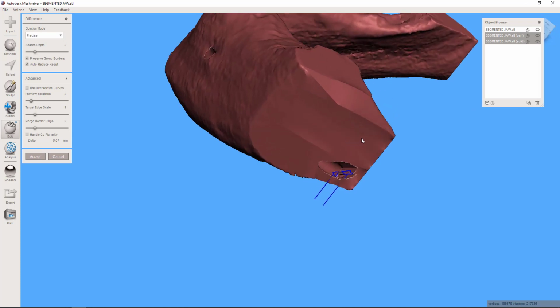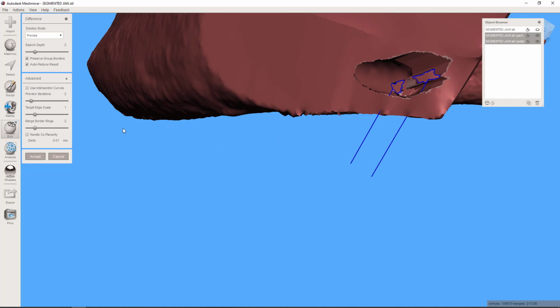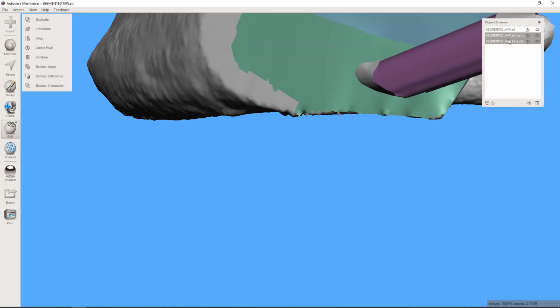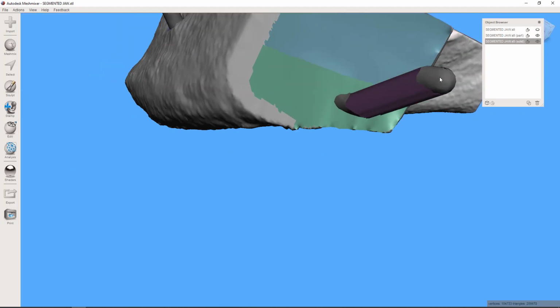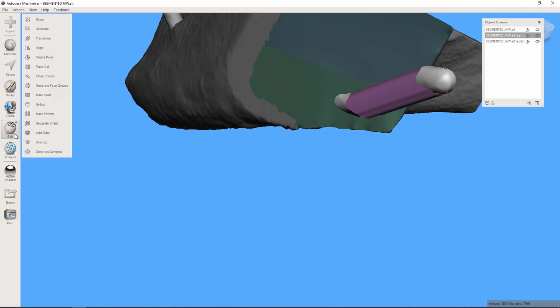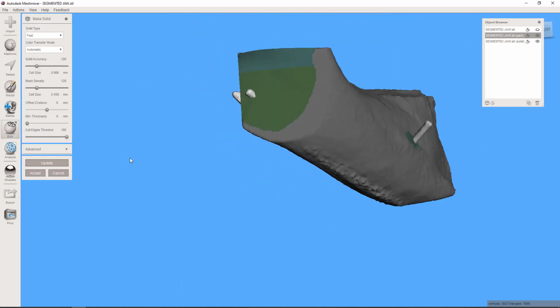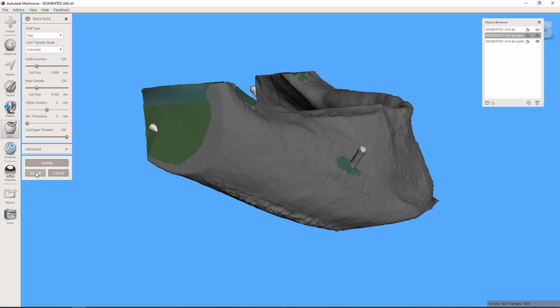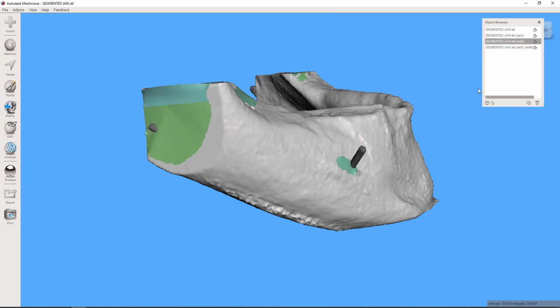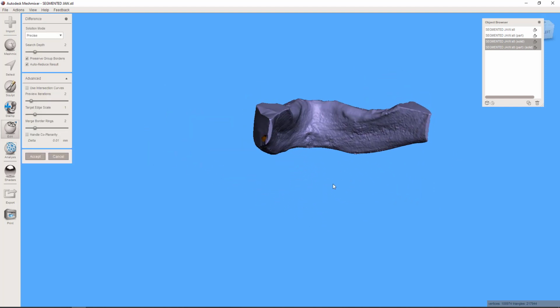Still didn't like it. And why is that? Something is really irregular about this nerves mesh, even though I remeshed it. So that's kind of unusual. But we got other options. Another really common option, just make it solid. As long as it does that without altering its shape, then we can accept that. And now try to subtract those solid nerves, and this time it works.